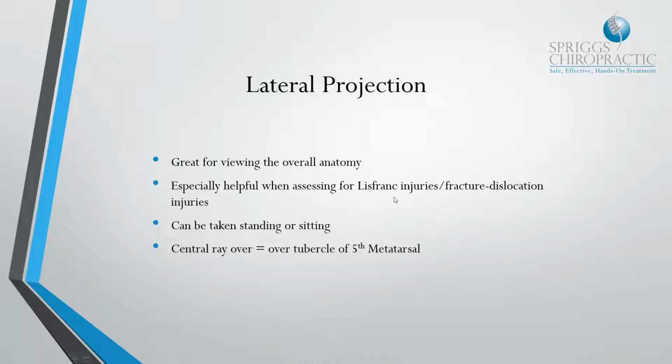So the lateral projection, again, is great for viewing overall anatomy, especially true for Lisfranc's injuries, fracture dislocations of the tarsals and metatarsals. This view can be taken standing or in a seated position. It depends on the ambulatory status of the patient. So if the patient has a significant foot or ankle injury and cannot stand, then you'll obviously take it non-weight bearing, so you'll have them sitting or laying down.